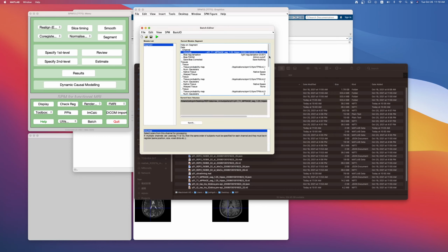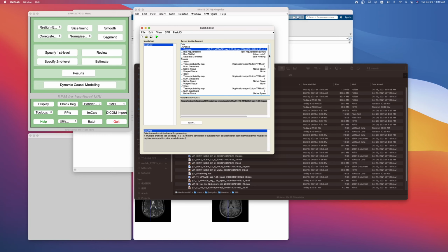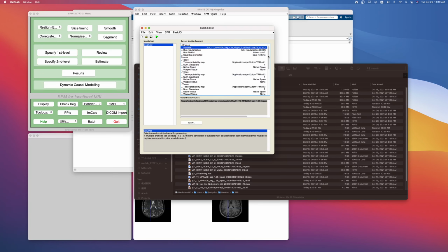There's really not much to do in terms of the setting up of anything, but there are certain settings. You can see there's no more X's we need to fill in, all right? But this is misleading because we do need more information than the default of these settings. So here, at least for this tutorial, I'm just going to talk about these. We're going to skip these because this is to do with getting a bias field correction. We won't have that problem here in this data set, so I won't get distracted to talk about it.